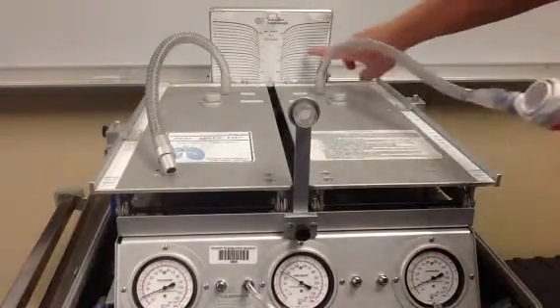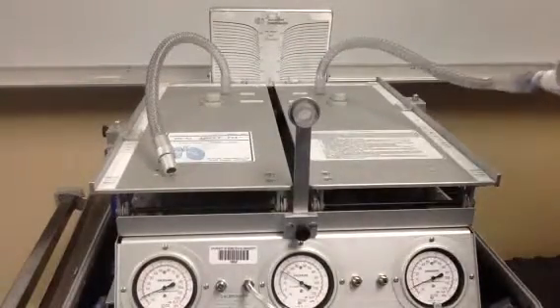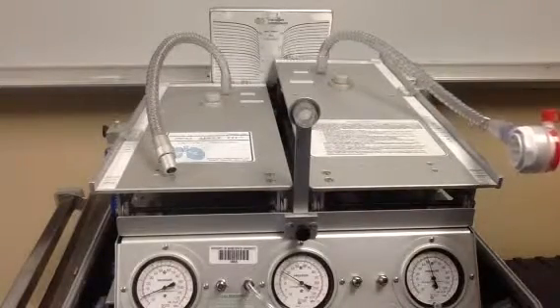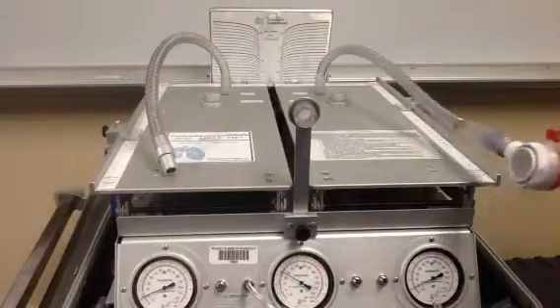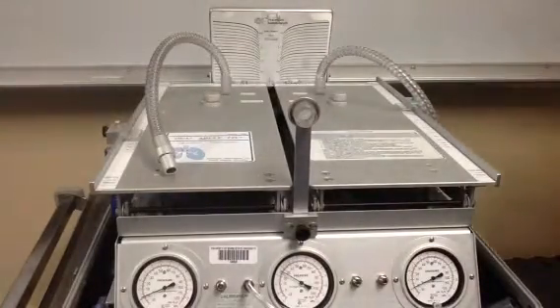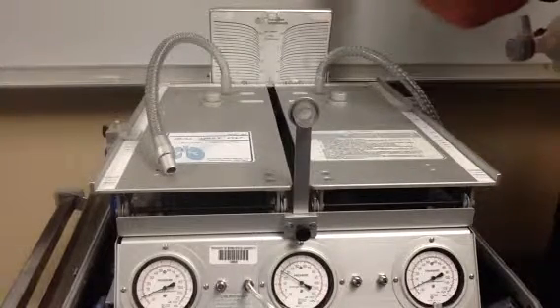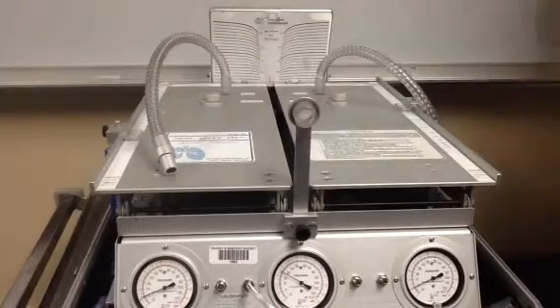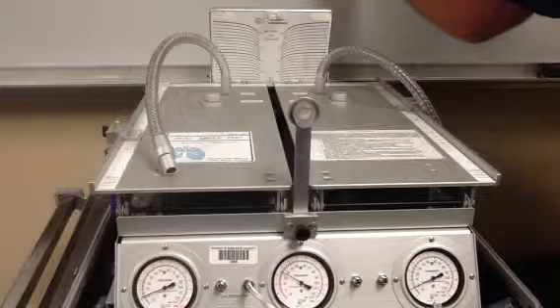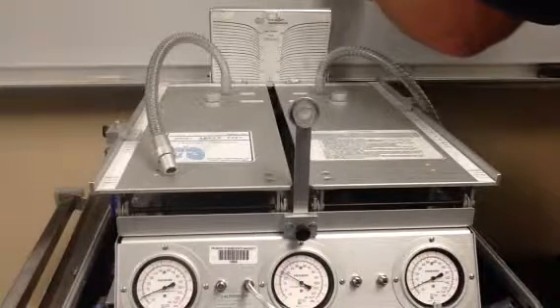And we've got volume that's measured on the scale in the back. So if I give a volume, I'm going to try to give a volume of 1 liter, and that's taking about 50 centimeters of water pressure. So we can calculate compliance based off of that. So we've got 1,000 milliliters. Oops, that looks like 1066. Per 50 centimeters of water.